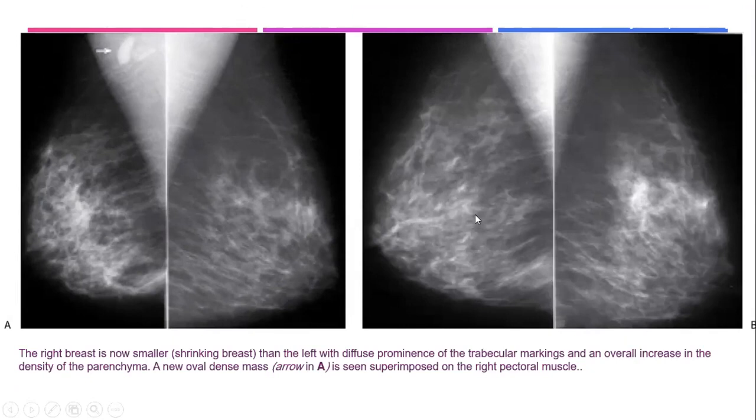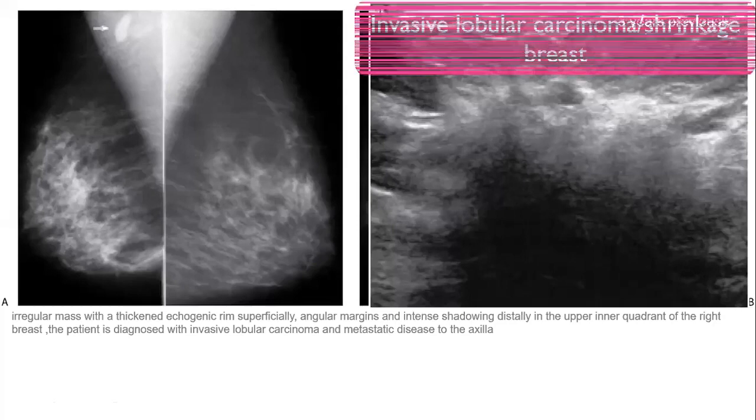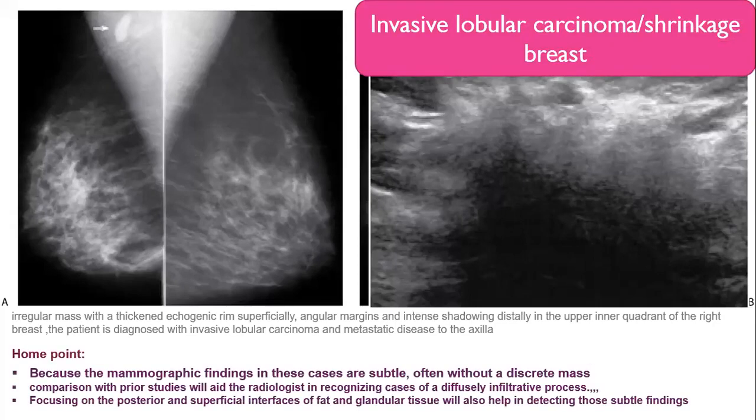We forgot to say this is the earlier mammogram and this is the recent one. When we compare, we can appreciate the changes between the two, and definitely the site of interest is the right one. So it is important to look for the prior mammography, okay?